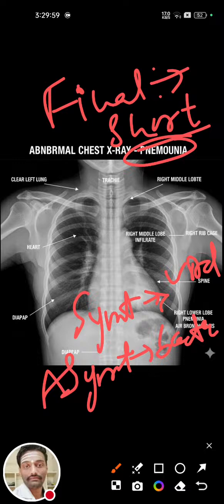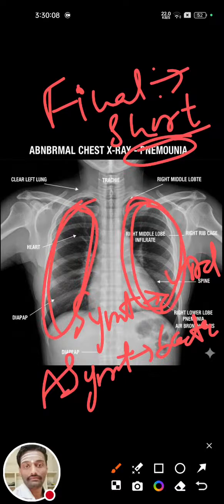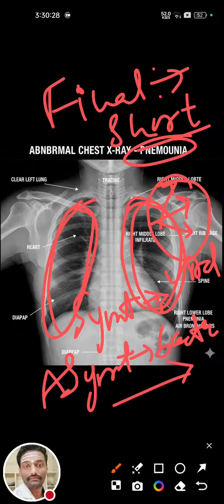Bilateral patchy opacities, bilateral meaning both sides, we mainly see in viral pneumonia, mycoplasma and aspiration cases. What is the halo sign, the bulging fissure sign, round pneumonia we see in children, we will discuss in our upcoming live streaming video in more detail about pneumonia.